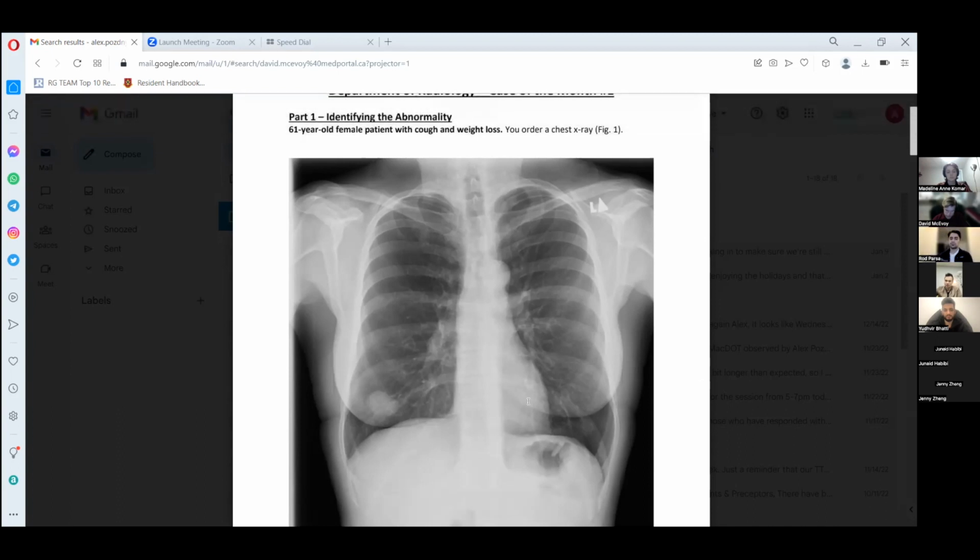So this heart contour is actually going to be important to discuss because it's not really including just the heart by itself. It also includes a lot of other structures that you can't really see very well if you're not looking for them in particular. So what else is hiding here is that we have a little bit of lung hiding behind the heart. We also have a little bit of pericardium encasing the heart. We also have some fat, pericardial fat, some soft tissues that make this contour a little bit smoother. We also have the major vessels.